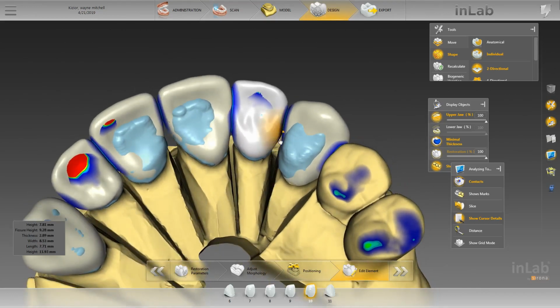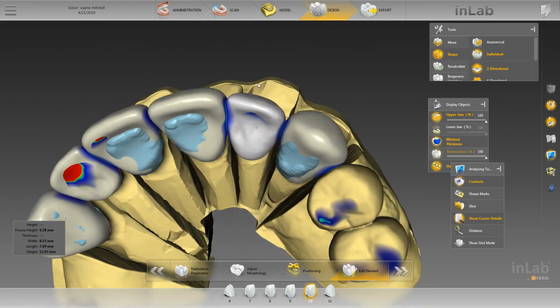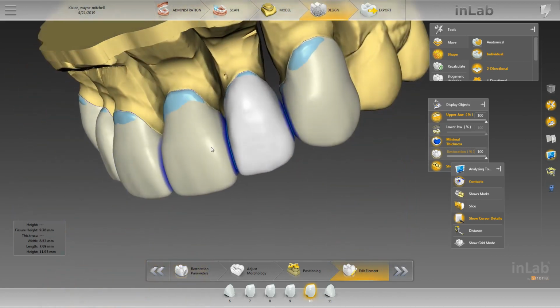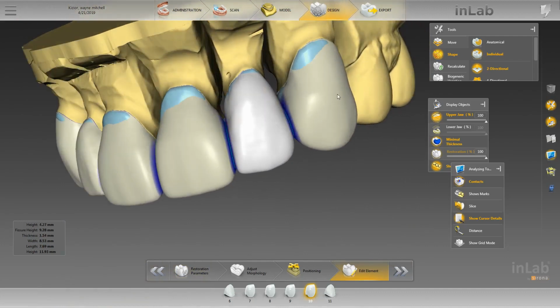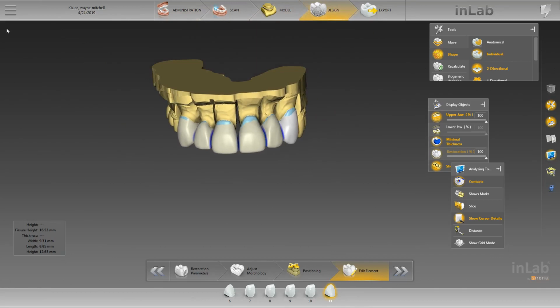And we'll do contacts last, so I'm not worried about that either right now. And you shouldn't be either. First, get the shape the way you want it. Get everything aligned where you want it. Contacts, save them for last. Okay. Let's save where we're at so we don't lose that.